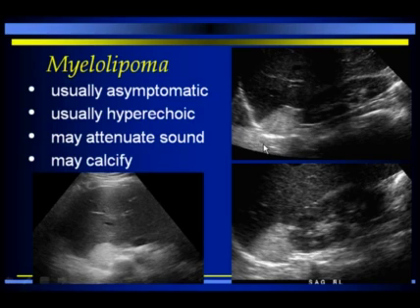If you can see definite evidence that the speed of sound has been altered because of the fatty content, then you can make that diagnosis. Otherwise, if it's just an echogenic lesion, you can suggest it, but we usually can't be definitive.